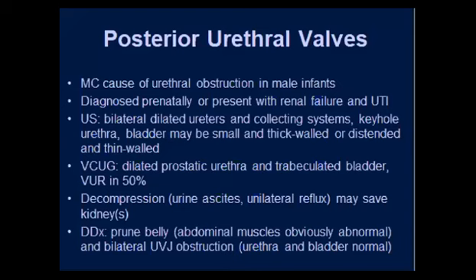When you do voiding cystourethrogram, it is easy to diagnose. You see a dilated posterior urethra, and they have something called spinnaker sail appearance. So this is what is called posterior urethral valve.